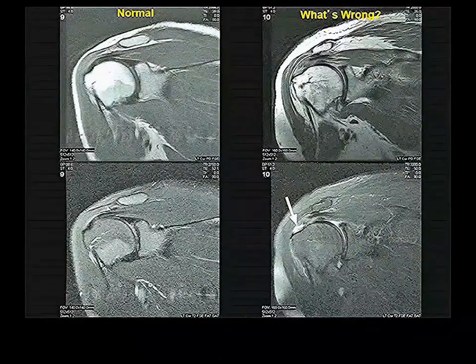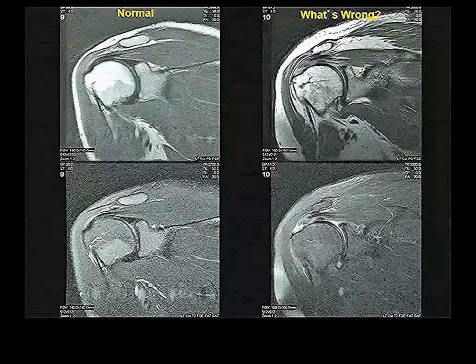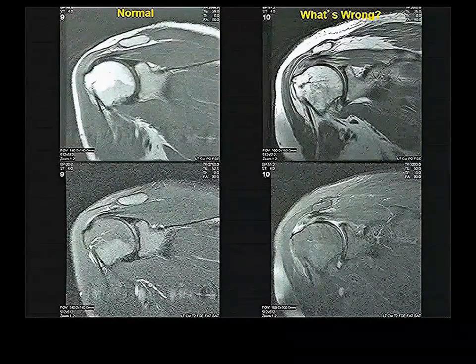This white standing fluid that you see on the T2, that's just edema fluid. That's just swelling as a result of the trauma to the tendon. This person has a rupture of the supraspinatus tendon. Could not get any clue of this if it weren't for MRI. You couldn't see anything about this on a plain film or a CT. MR is so good for soft tissue injuries, and this is a ruptured supraspinatus tendon.